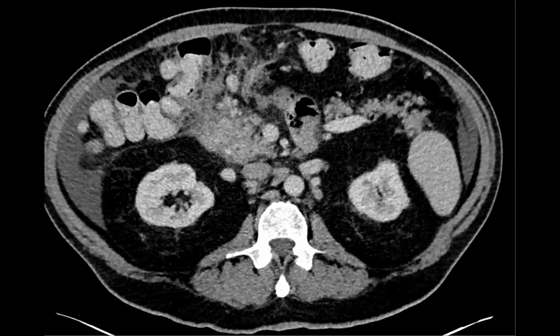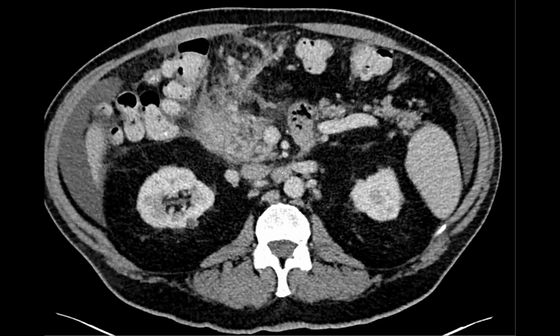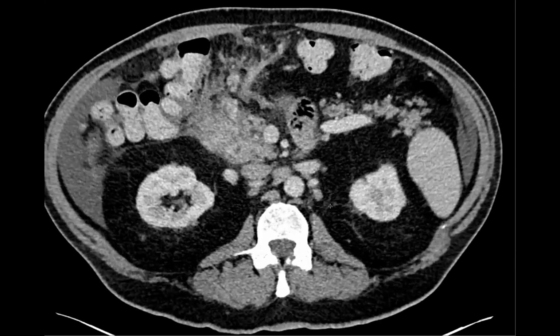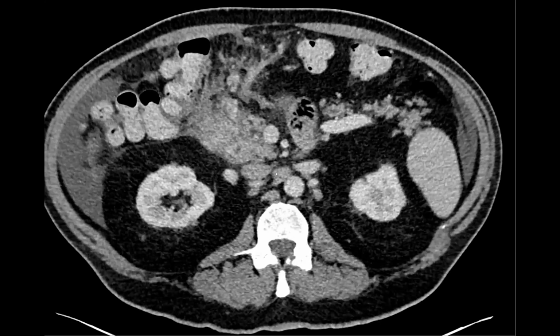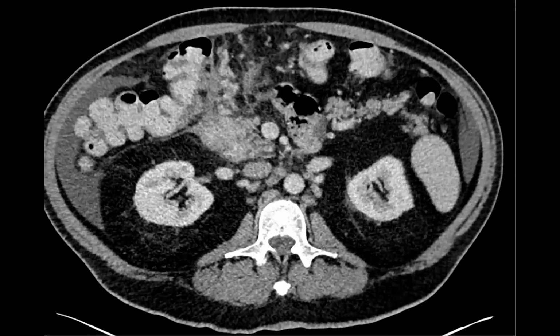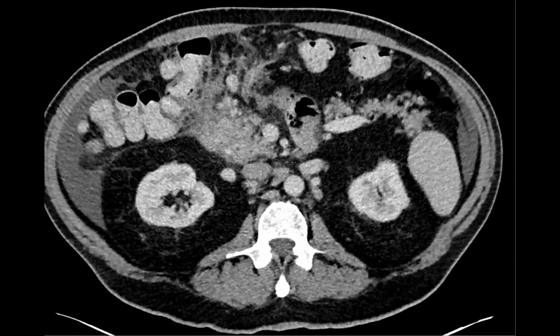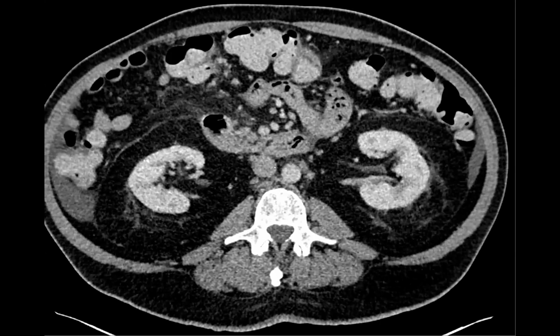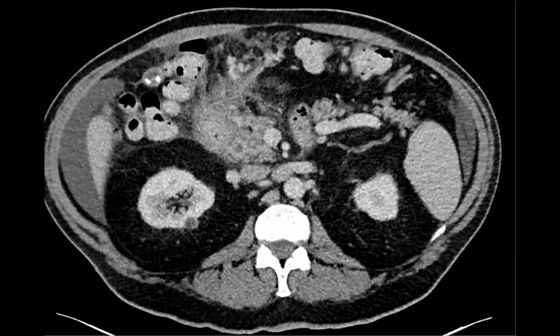But the thing you really want to be careful about is retroperitoneal nodes. For example, this node I think is highly suspicious, and it's just below the level of the renal veins, and that would be considered a retroperitoneal node. So this would be a distant metastatic node. In cases where we're not sure, but we've drawn attention to a node like that, they can do a PET, and if it's hot, then that's usually metastatic disease. I have sometimes even biopsied nodes that are retroperitoneal just to prove that this is metastatic.